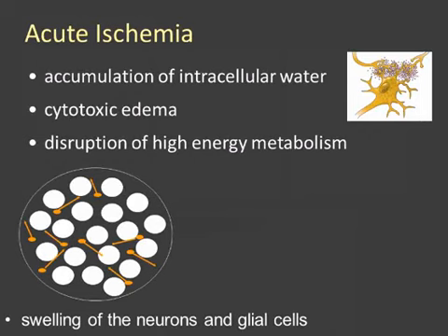This is a possibility to see acute ischemia with CT. Should we do MR, and why aren't we doing MR all the time? The best sequence for detecting ischemia in an MR is certainly diffusion-weighted image. What do we see on diffusion-weighted image?